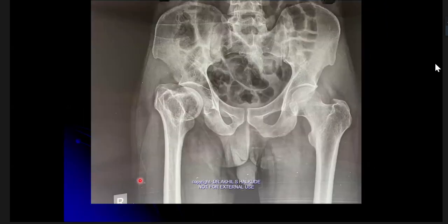So this we'll take as a long case. This was just to start the session because those were the day-to-day practice cases: pneumothorax, skin fold, CVT, what you see. I want to see you describe this lesion as you would for a long case. Take your 1 minute, describe it in one shot, how you want to describe it.